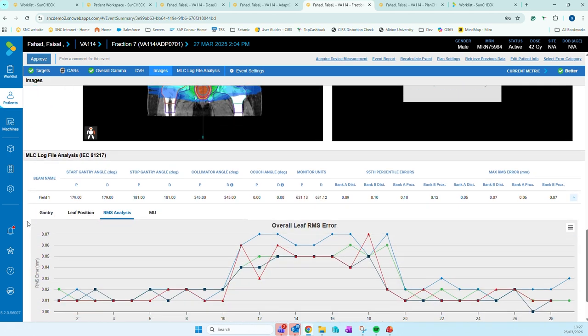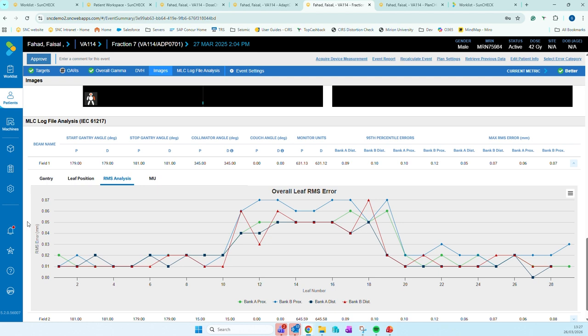One of the really cool things about bringing in the log files and using them for the dose calculation is that the statistical log file analysis that was also brought in this release is also applicable for your Ethos deliveries. So you can see not just what the 3D dose was for your log file, but you can also see the performance of individual parameters, such as your MLC root mean square error for each leaf.